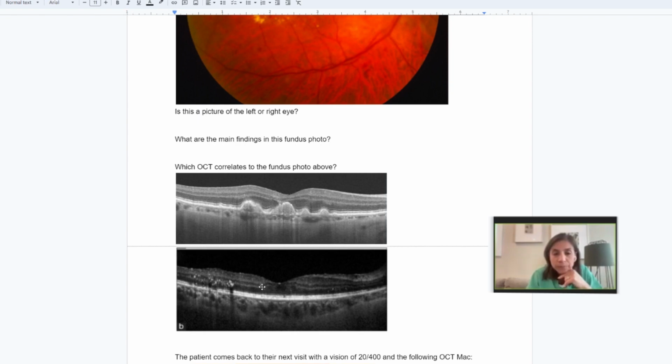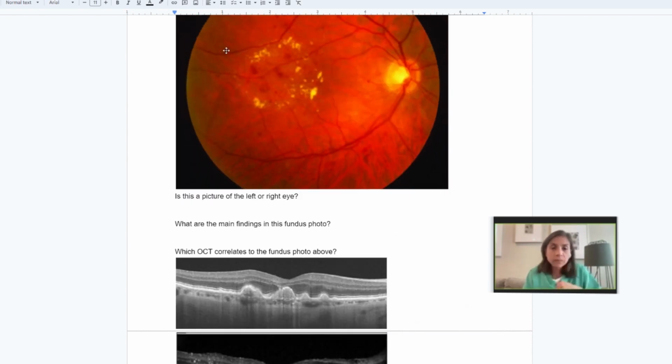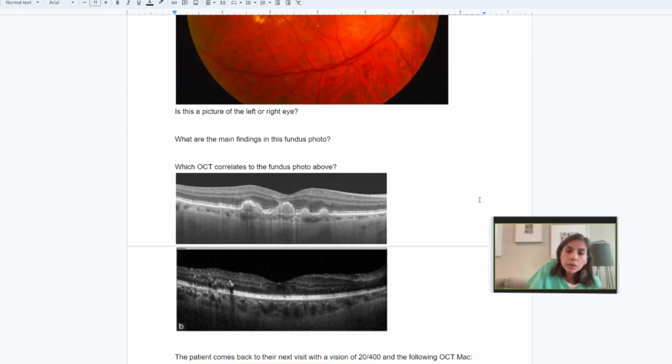And I've always considered hard exudates as possible evidence of prior edema. And so that tells me that this ring here is from old, dried up edema, leaving behind all these deposits. Is that correct to think, or? Yeah, I guess you can have hard exudates both in active and old edema. Sometimes you can have it with active thickening as well, surrounding the active leakage. But sometimes it can be old.